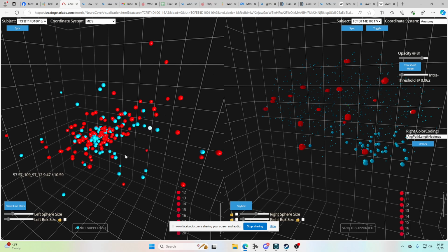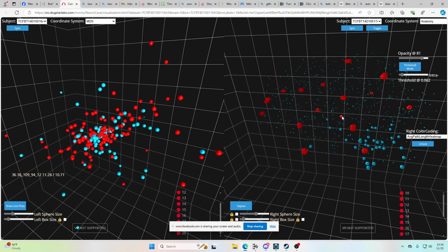When you say multi-scale, what does it mean? Well, the different scales are different scales of data. You have a brain that's about the size of two of your fists, and it's been decomposed into about 6 million voxels.